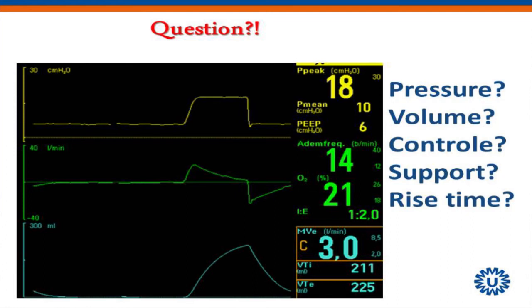It's quite fast. I think it's quite slow. It's about, I think we put it on 10%. And normally you will see that when you put it faster, it goes straight up.